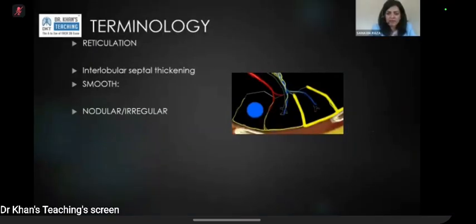ago, when the general CT was much thicker slices, so 5 millimeter or 2 millimeter slices. These days, we recon most CTs on 1 millimeter. So literally any CT chest is an HRCT if you think about it. Just the appearance of the recons can be a bit different. But the technical term of 1 millimeter slice applies to most CTs that you report every day.